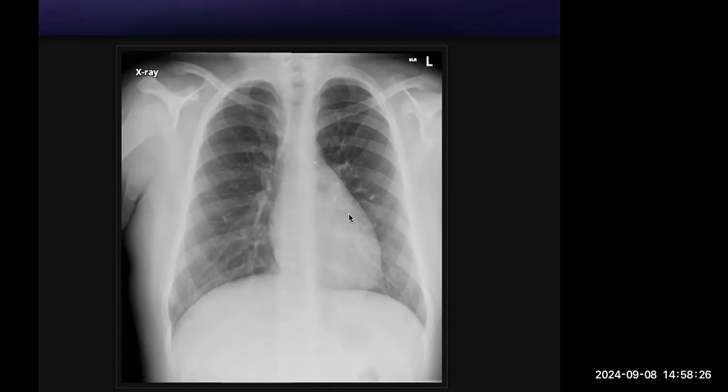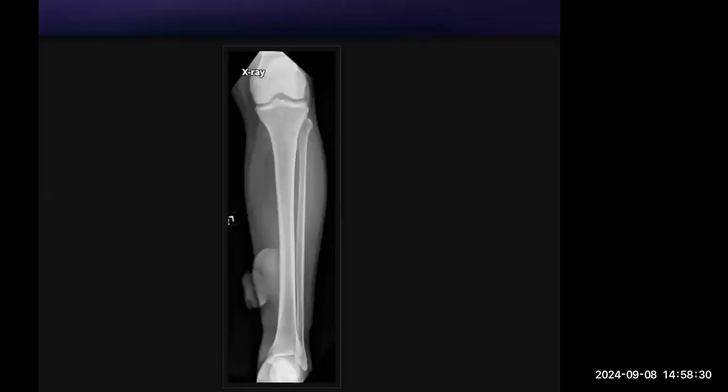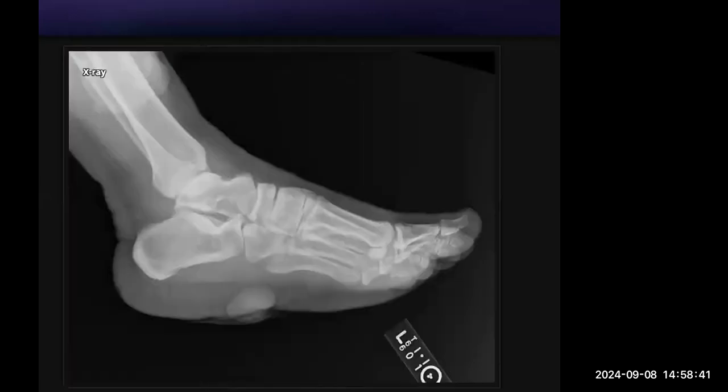And so that's it. Just for understanding that such a thing exists, I showed a case like this. This one you were spot on. You gave me a good set of differentials for a soft tissue mass in the leg. Often in X-rays, when you don't see it in one view, feel free to ask for a lateral view before you go to the next modality. Sometimes you will see the abnormality, and always look at the corners.